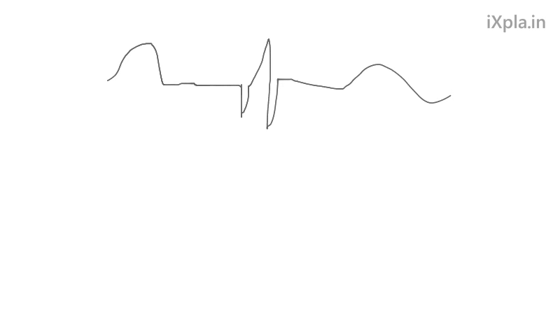Let's see what else we can go over. Oh, the segments. The P wave, you got a segment, T wave. Okay, so you know I named the waves. This would be an interval. Intervals means they include a wave. Segments mean they don't include a wave. It's just a flat line pretty much. But more importantly than knowing what a segment is and what an interval is, being able to define them.